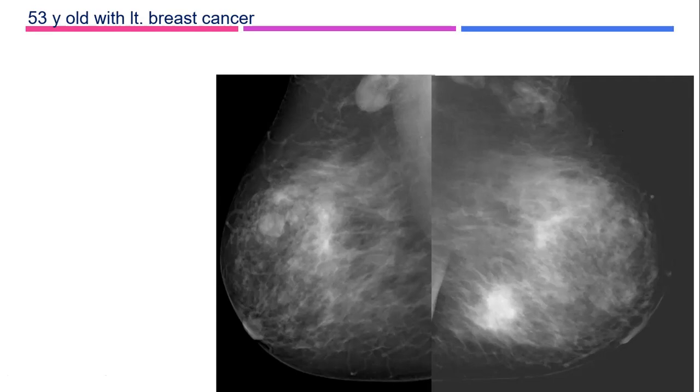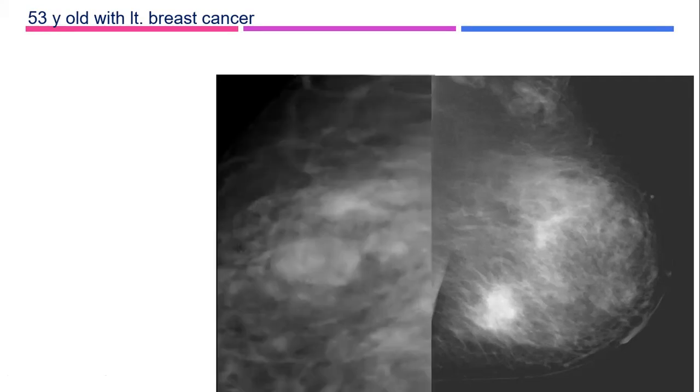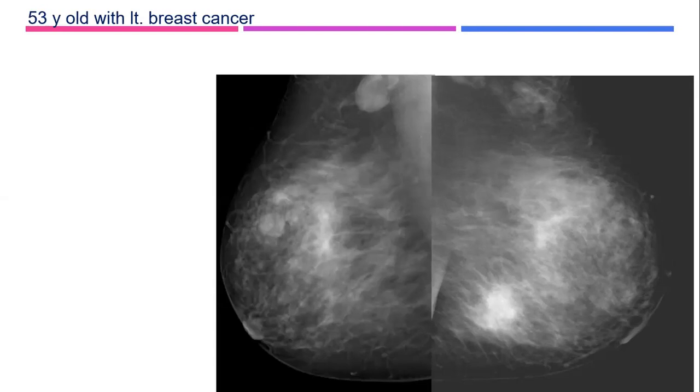No, but because you told me that's a cyst, ultrasound. It was a cyst, yeah. You will see it. I'm going to show it for you. Yes, I think it is a cyst with a ring. No, well-defined wall and echo. It was a cyst. But even if I told you it was a cyst, you have to tell me there is some architectural distortion in the area.